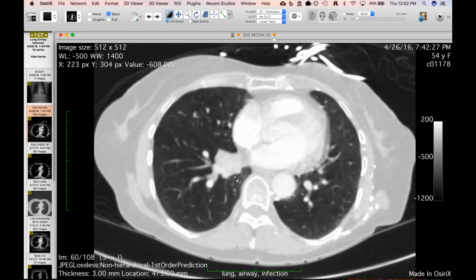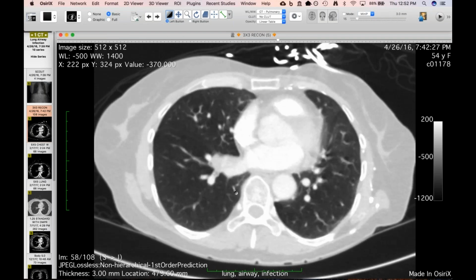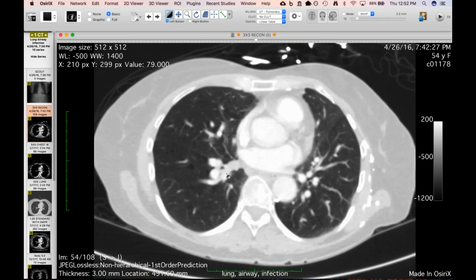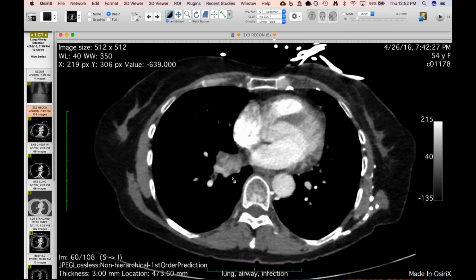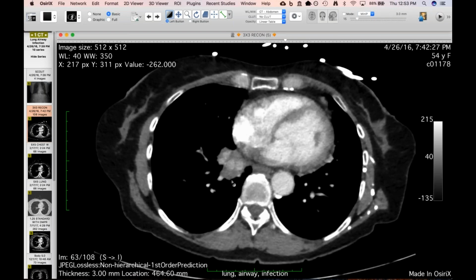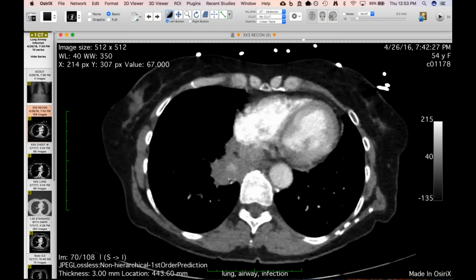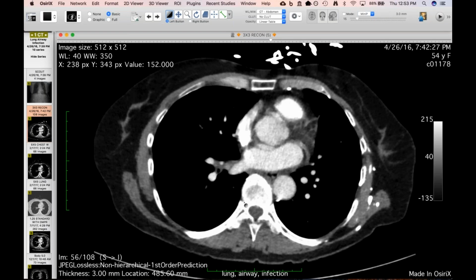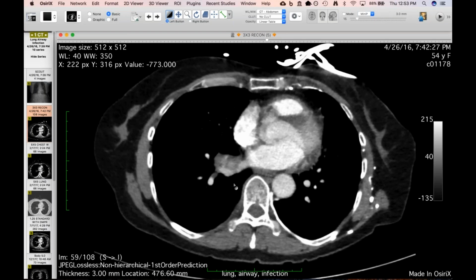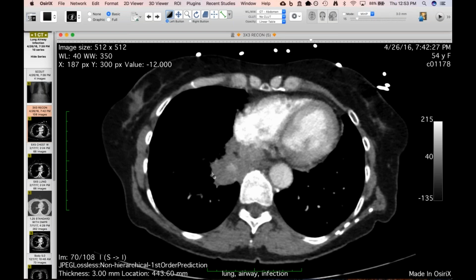But then you see in the medial right lower lobe that she has this area of mass-like consolidation. And you can see that the airways kind of cut off in here. And I'm showing this not in the order I saw stuff because I saw a follow-up on here. But I will point out one thing you can see here, which is kind of interesting: these look like mucus-impacted airways with very high attenuation mucus. Anything in the lower lobes, especially when you don't see airways going into it, always look, this was not a sequestration. But at this time, she underwent a bronch that was negative. They just got some inflammation. They thought maybe she had cancer.